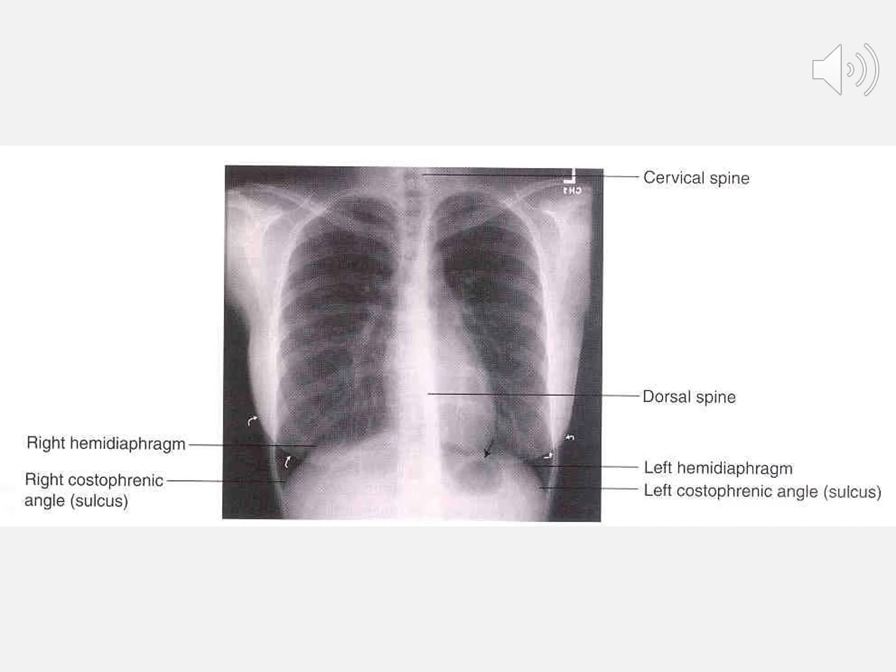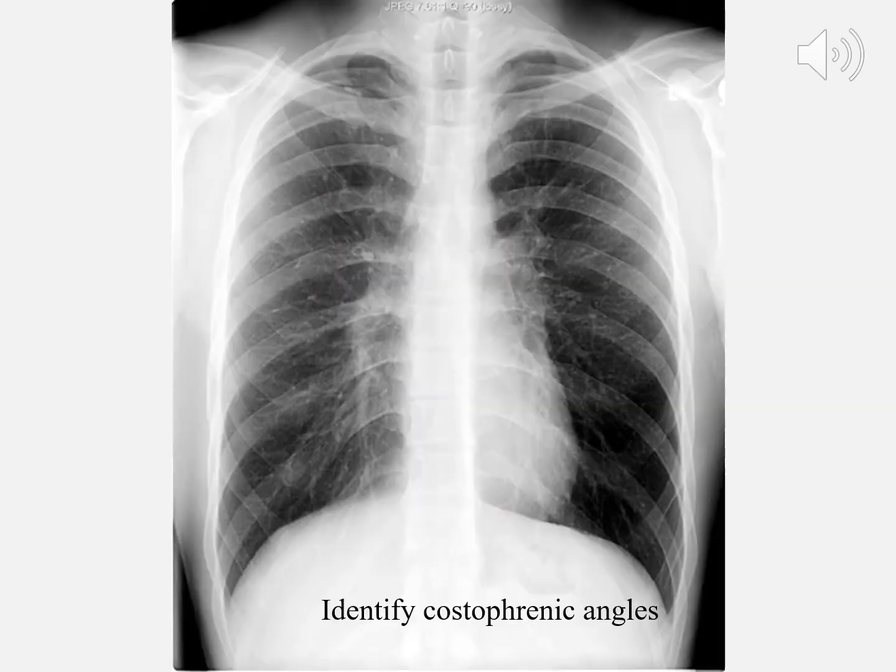So think of that when you're viewing, because we tend to look at this and think we're looking at the front of a patient towards the back. It really does help in your mind interpret things when you start thinking about that. It's an evolution, but just put that in your brain, and we'll talk about it more as we move forward. So this wants you to identify the costophrenic angles. This should be reviewed, but do you know where they are?